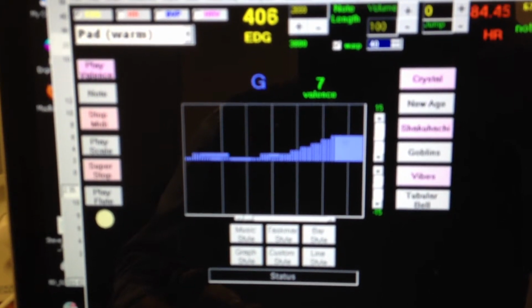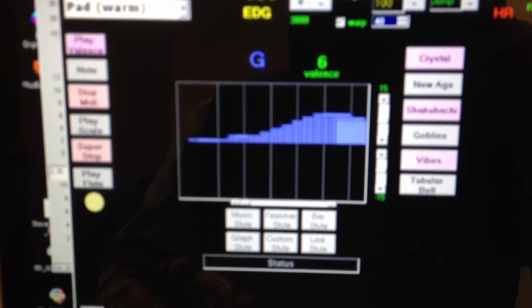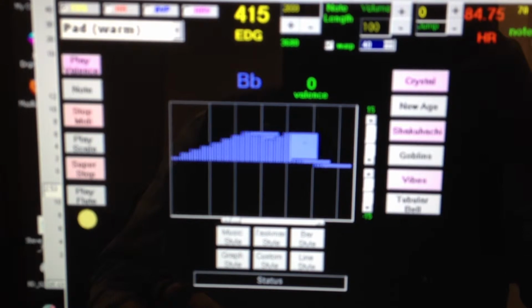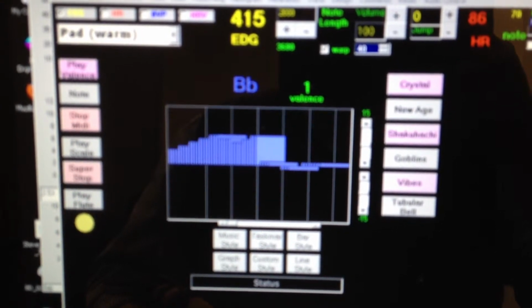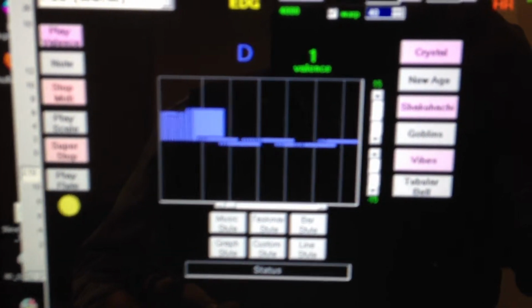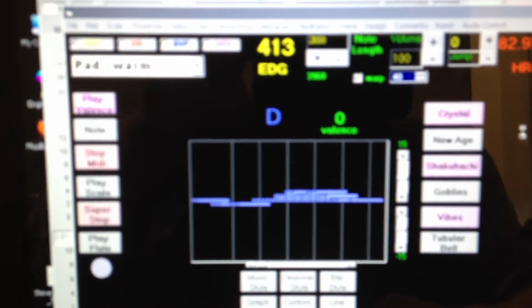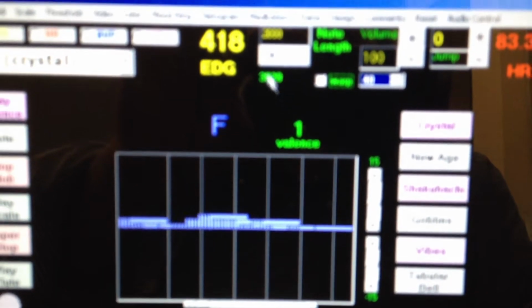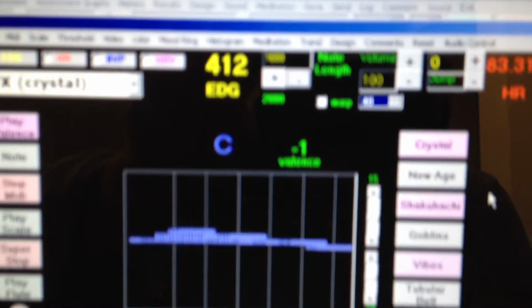So now we can see the tone moving up in pitch as my electrodermal valence moves up, and then it recenters so that I can move up or down, and we'll hear the change in pitch and actually see the pitch being played. It looks like we have the forced D minor checkbox checked in case we happen to want to jam along. Now we could press crystal for a different MIDI patch setting. Take the warp off. And let's move to every 1 second.